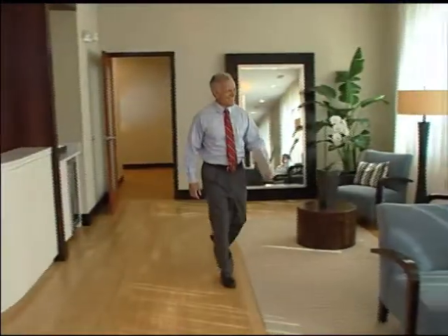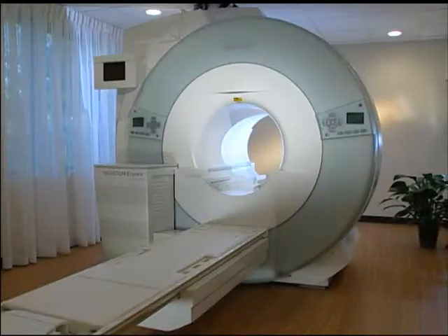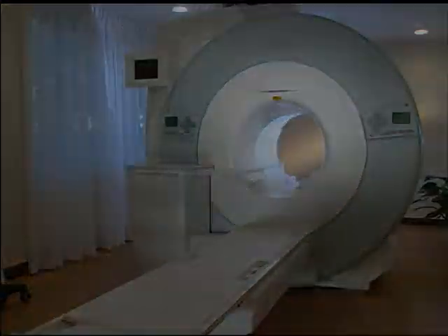Welcome to this MRI patient education videotape. Your physician has ordered an MRI medical condition. What is MRI? MRI stands for magnetic resonance imaging, and for the next few minutes, we'll discuss the MRI examination.